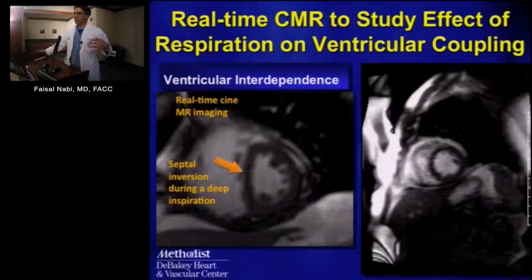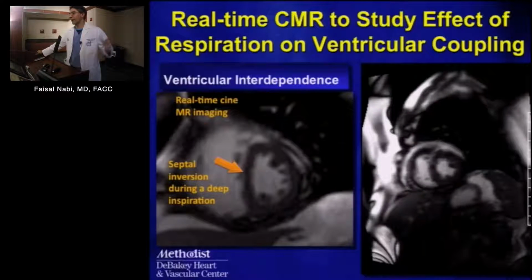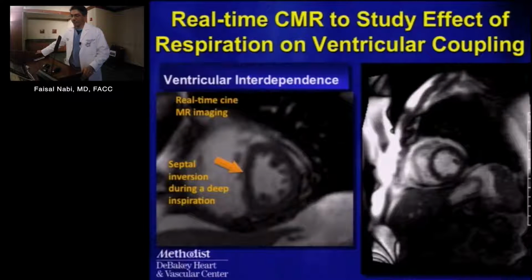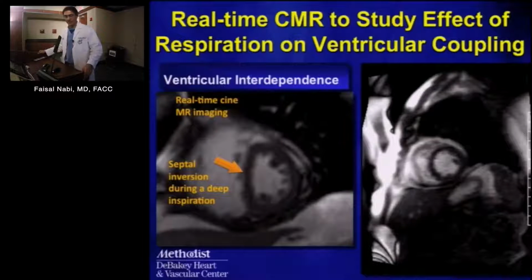With the increase in flow on the right side, there's a shift of the septum towards the left. And this process is reversed with expiration. So this is just an example of that.